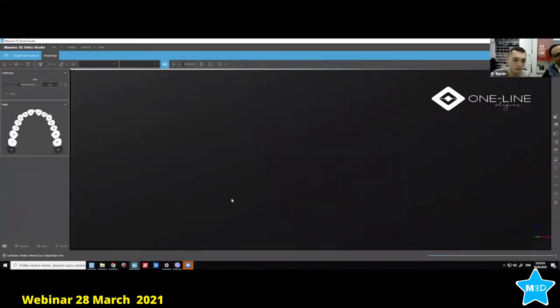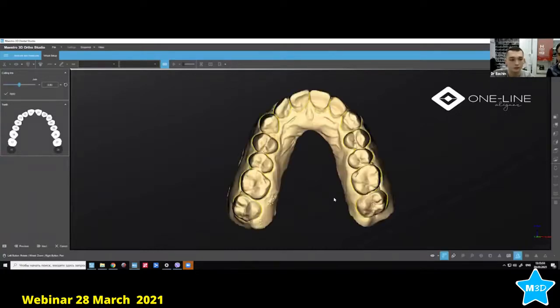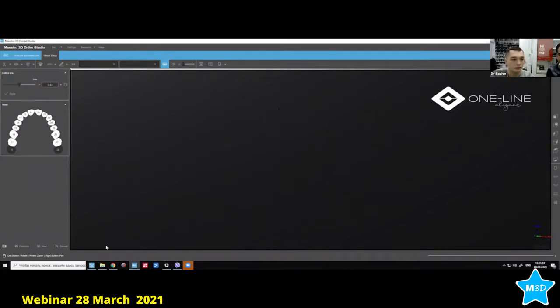I believe this was pretty fast, right? Okay, so now we have to wait to see if the software has actually recognized the tooth outlines.